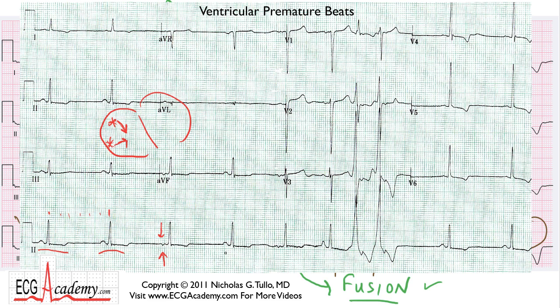Then you have what looks like a sinus beat, then another odd-looking atrial beat that's a little bit more premature. Here the rate is 300, 150, 100, 75, 60. So it went from a little below 50 to about 60. So this is a premature atrial beat, a PAB or PAC. And this is probably a fusion between those two foci, the normal sinus beat and the premature beat. And then you have a third P wave morphology, which is kind of interesting.